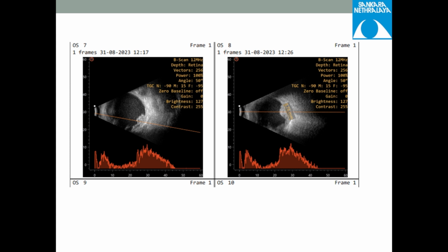Whereas VKH is an infiltrative tissue. The choroid looks attenuated within it. It won't have that heterogeneous composition. Similarly, this will appear. This is not a choroidal hemangioma because you see there's so much within it, a homogeneous mass, right? But it doesn't appear like choroidal melanoma. There's no angle kappa. It's allowing ultrasound to pass through and then come back to you. So you get a very uniform thing. So we don't know what that tissue is. Neither is it so internally high reflective to suggest that it's vascular.